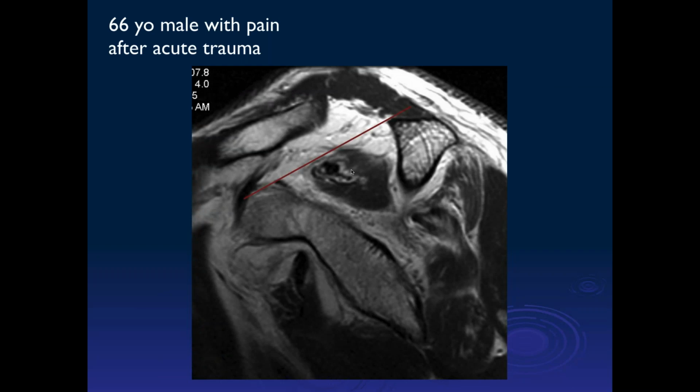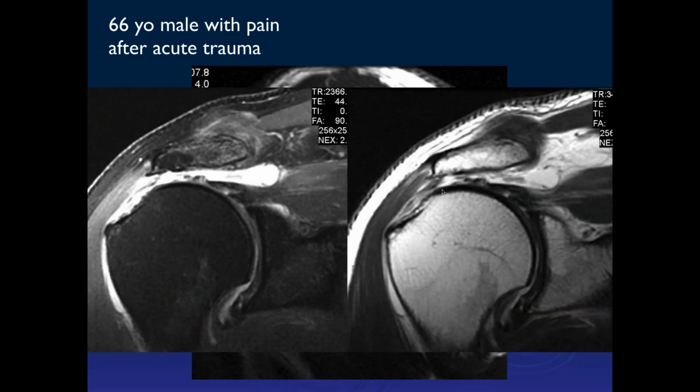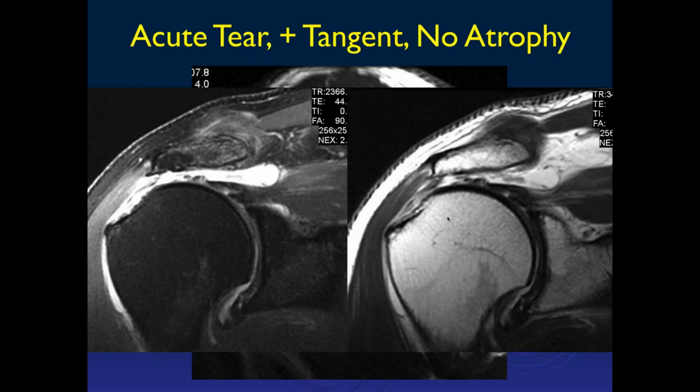And these are the patients who are at best risk for doing rotator cuff repair, because the muscle is normal. They're often athletes that have trauma. They have relatively normal tissues, though there's a little bit of degenerative tissue here of this cuff. So this is someone who had a tangent sign but has no muscle atrophy and is actually a good candidate for doing a repair. So just remember, proximal retraction can produce a positive tangent sign in someone who still may be a good candidate.